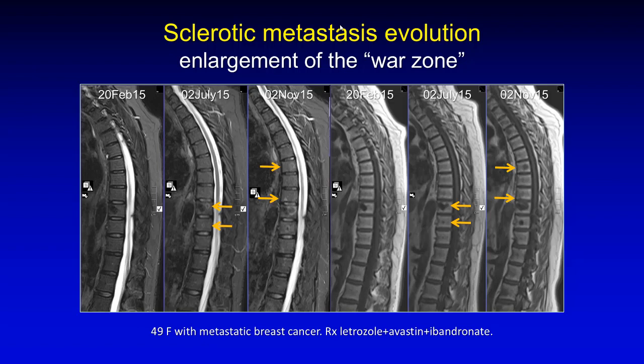Okay. Now, if you follow a patient who doesn't respond over time, you can see this evolution occurring. So here is a sclerotic metastasis. And look at this little island over here. You can see that little thing over there? It's difficult to see. But look what happens. The ring gets bigger and bigger. Here is a little ring. You see, there's a little bit of calcification, a little ring developing around it. Look what happens. It gets bigger. And here's another ring developing.